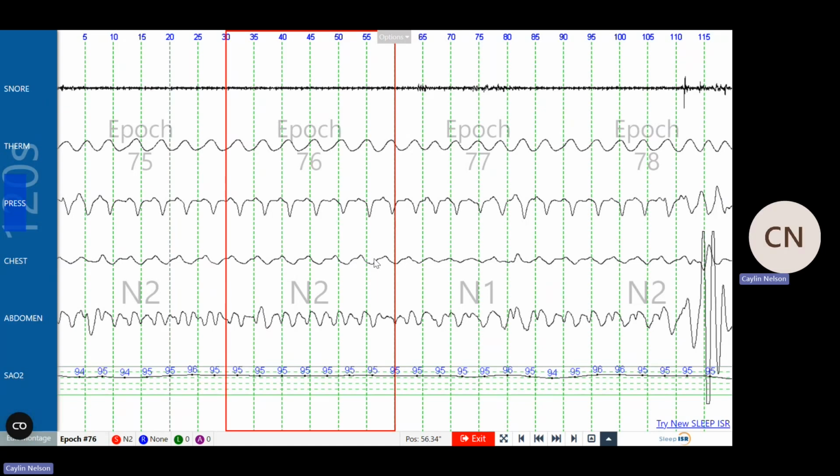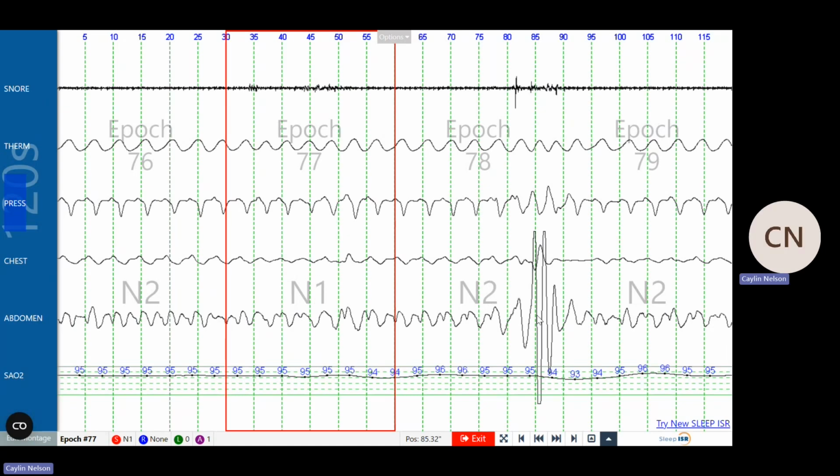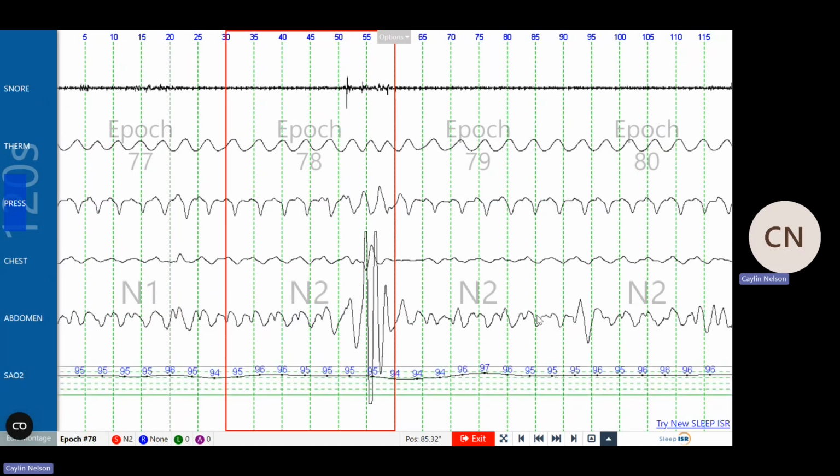You can just look at it and you can see that the bottom and the top peaks of each breath are pretty consistent. Up until about 115, there's a slight change you can see in the effort channels, but you can also see the slight increase in pressure of the airflow channel. So moving on to 78, we can see the difference between 78 and 79.